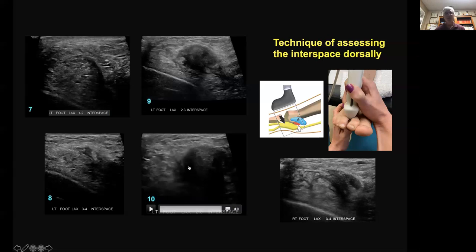And you notice in this patient, we really don't see the demarcation between the interdigital neuroma and the bursa itself. And so over the last several years, I call these neuroma bursal complexes, because grossly you can't tell the difference between the neuroma and the bursa accurately. And I've had cases where clearly I see a neuroma and it's mostly bursal tissue and vice versa. So I call these a neuroma bursal complex.